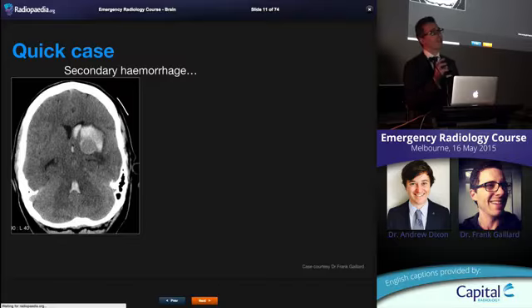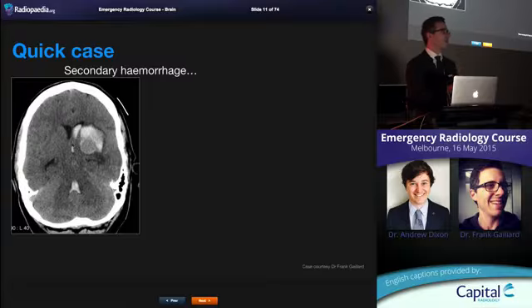Well, the first thing is patient demographics. A young patient with a hemorrhage who hasn't been hit on the head has an underlying lesion. You have to find it, and you'll usually need to go to MR. But we're not going to cover a lot of MR in this course because one, there's not the time, and two, you usually don't get exposed to that in the emergency setting. So CT and CTA is really the core of what you are going to be using.